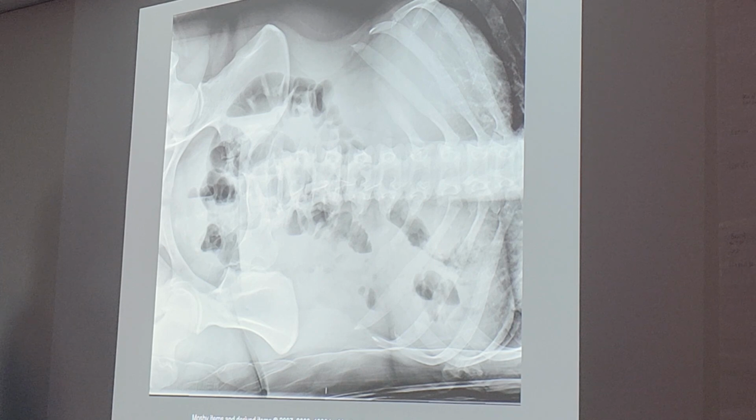What about the exposure factors? Exposure factor is good, darkening, contrast is good. It's good? Okay, explain why. Because you can see the air, you can see the fat, and then you can see the bone nice and white. Good job.